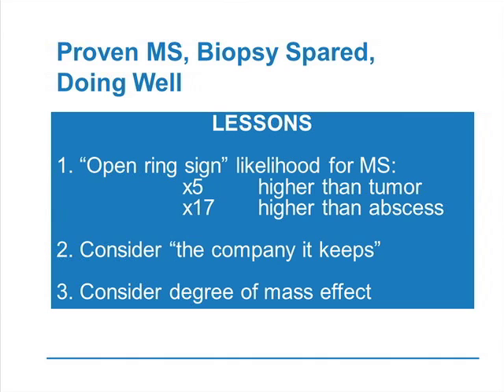In the same patient, you can look a little further, and you start seeing other lesions that are present, lesions that do not enhance, in fact, that are concordant with T1 hypointensity. So in this patient there's a different set of lesions, some that seem to be enhancing, and others that do not, that seem more chronic.